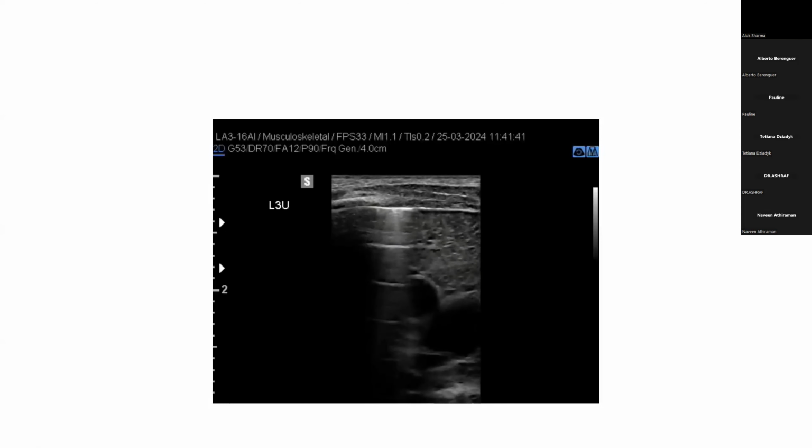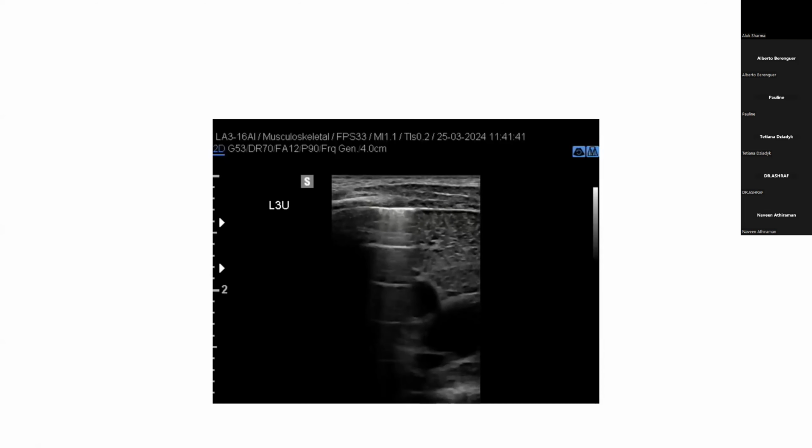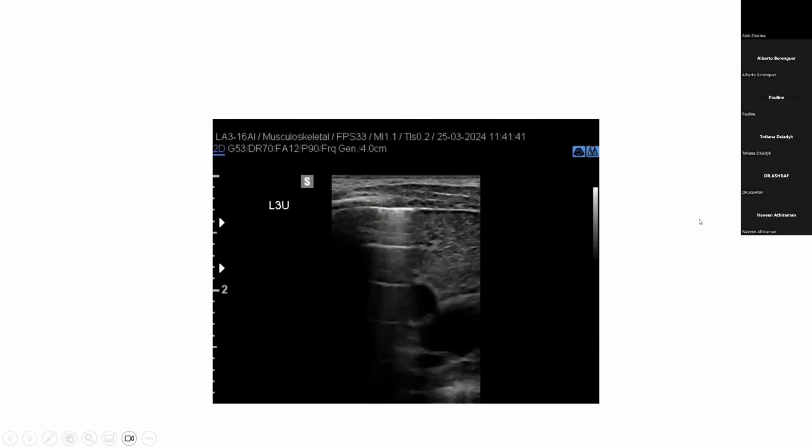Possibly, it's definitely an organ of some kind. Maybe an angle of the spleen. It doesn't look like bowel, doesn't give me that appearance. It's very tissue-like. Yeah, indeed. And I was wondering, is it liver? But that would be strange because it's not up, and for a thymus, it's also not the position of it. No, absolutely right. So maybe it's the spleen, indeed.